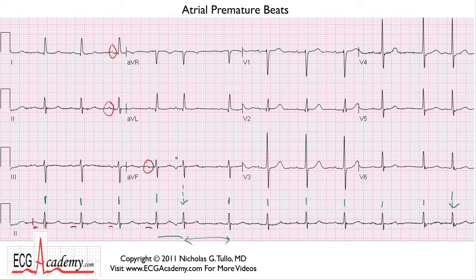Well, we sure can. Now, here's a lesson I want to bring out, and I've mentioned this time and time again. When you look at a P wave, it tends to have fairly rapid changes in voltage. In other words, the slope of the P wave is pretty sharp. It's a kind of a spiky signal, at least compared with a T wave, which is more broad and slower in its rate of change of voltage. In electronic or physical terms, if you've taken physics, there are high-frequency components to this signal that relate to the rapid change in voltage, whereas T waves generally tend to be restricted to low-frequency signals.